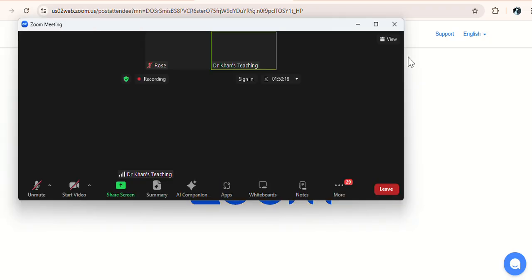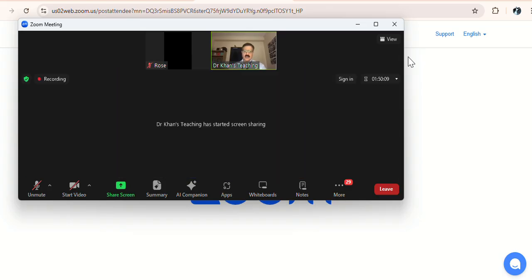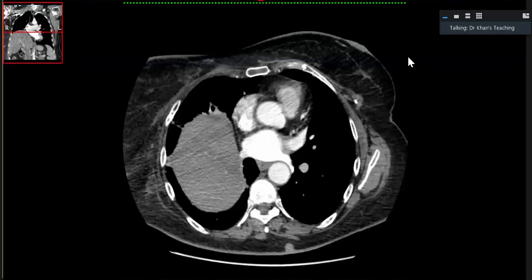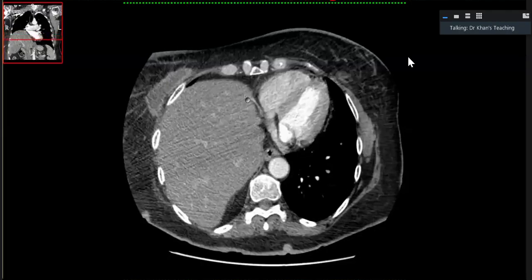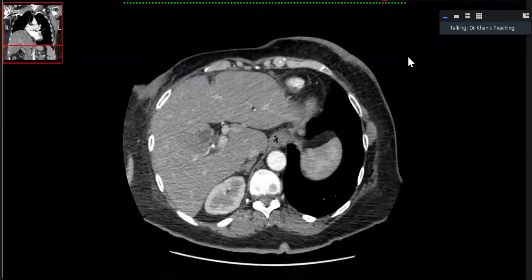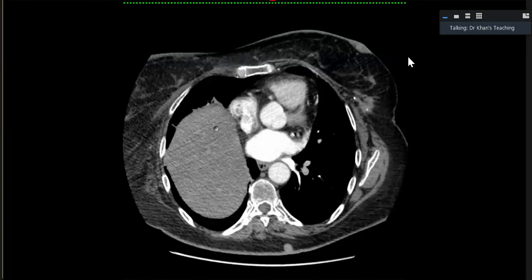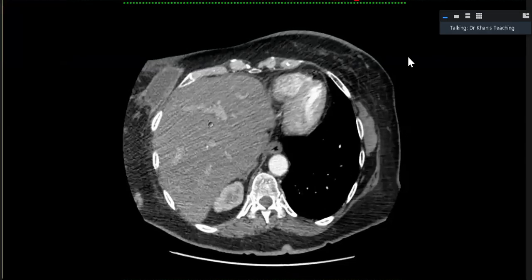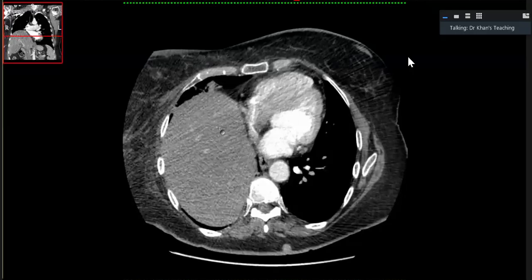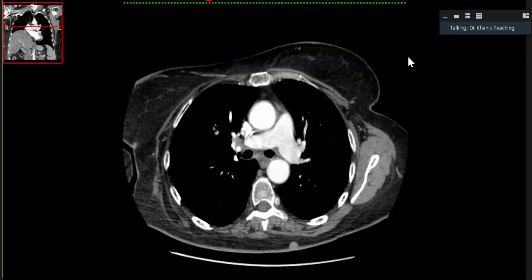But in the exam setting, this was a simple but trick type of presentation where the candidate did very well to pick up that there is a raised hemidiaphragm, because people actually miss it at times, that the liver should not be here. And of course, this abscess I had told you, so we were not interested. As soon as there is paralysis, then your mind should be working on why paralysis.